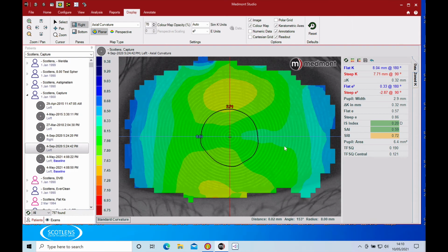It gives us a better representation of the cornea as a lens, which of course it is, but it's less good from the point of view of seeing any detail abnormalities. And you can see that the tear film blob at the bottom of this map is harder to see. So axial is the rays of light, if you like, going through the visual axis. So there's a mathematical sphere going onto it, and that's similar to refractive.